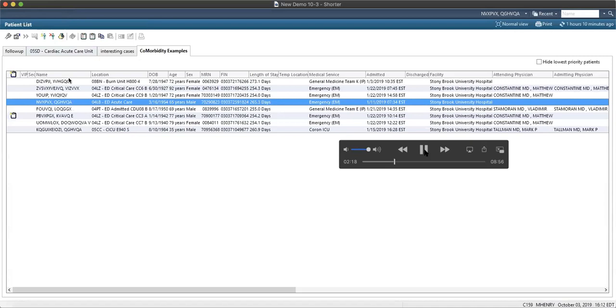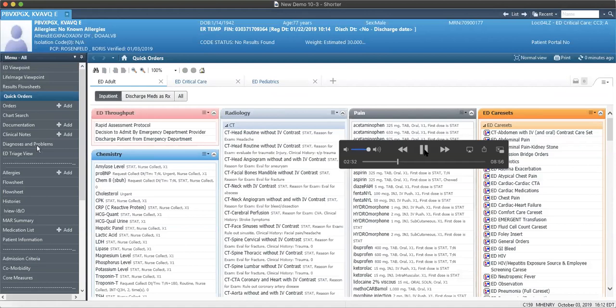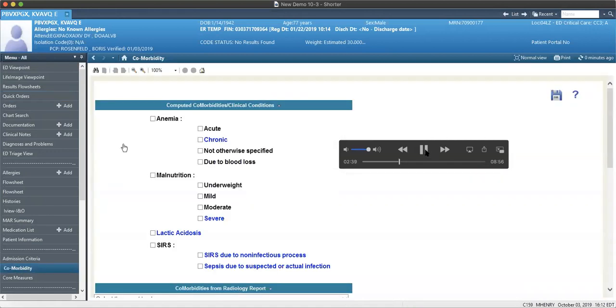We're going to do a patient now with a fall. Patient has previous condition of malignant melanoma. Patient had a trauma survey done, but there were several. As you see, Dr. Henry clicked the comorbidity tab, which is really the launching of the Retrieve software.